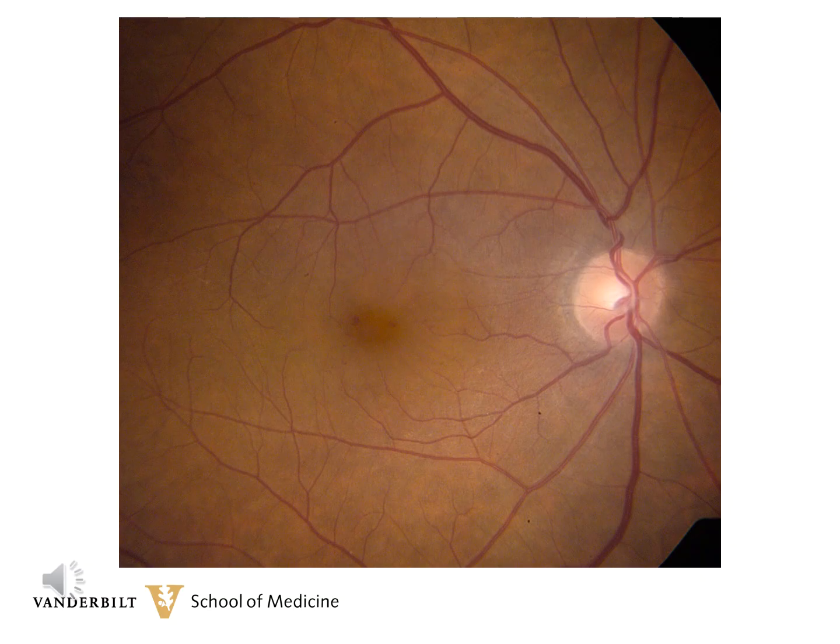So take a look at this photograph and look at it closely and see if we can come up with the correct diagnosis. Now, what you can see is an abnormal foveal reflex. It's not really sharp like it should be, and there are two small dot hemorrhages or aneurysms, one on the nasal side and one on the temporal side of the fovea. Now the nerve is pink and sharp, the veins are normal, there's no dilation, there are no cottonwool spots, no exudates. So this is not a vein occlusion, this is not diabetes, not hypertension, but there's a problem right next to the fovea.